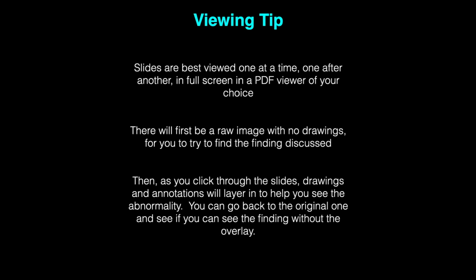After watching this video, you should be able to, number 1, recognize and describe the radiographic presentation of Legg-Calvé-Perthes disease. Number 2, recognize and describe the radiographic presentation of slipped capital femoral epiphysis. Number 3, stratify hip abnormalities according to presenting age of symptoms. Number 4, identify the normal appearance of the pediatric hip on radiographs.